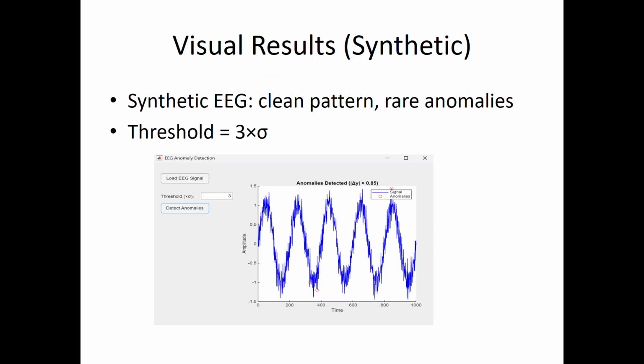red, as we said. We then demonstrate the tool's output visually in two scenarios. In the first, we use a synthetic EEG-like sinusoidal signal with noise. Here, only a few sharp dips are flagged, demonstrating the algorithm's restraint and precision.